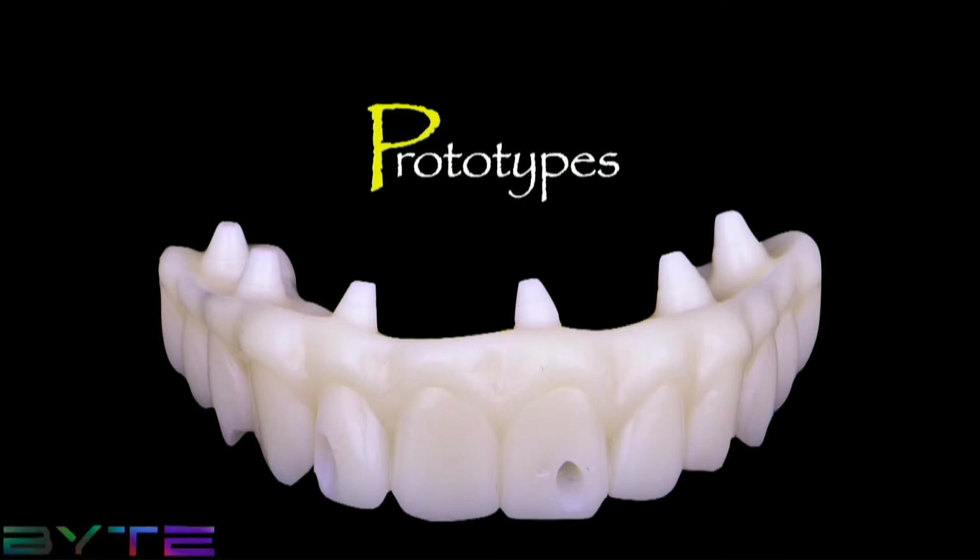Now I'd like to emphasize more about the use of prototypes, which I think is underused in our region here. I think those are very valuable things to use, especially on those cases. For those of us who are not aware of what a prototype is, it's basically a replication of your final product. This really helps you visualize all parameters that are included in your final restoration, including the screw axis trajectory.